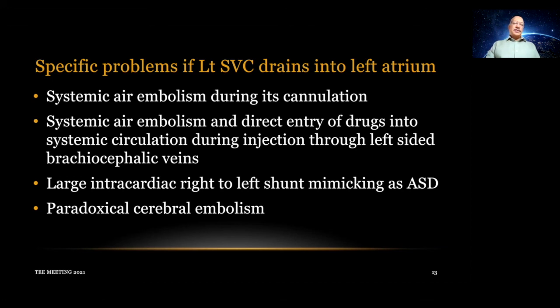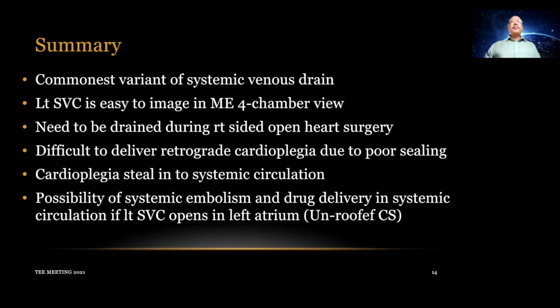So it increases the right to left shunt, mimicking an ASD. And in its presence, there is always a possibility of paradoxical cerebral embolism.